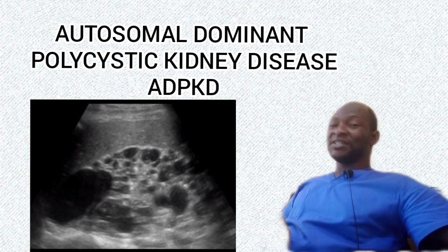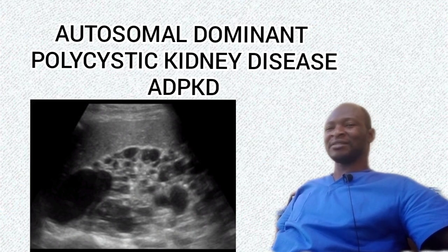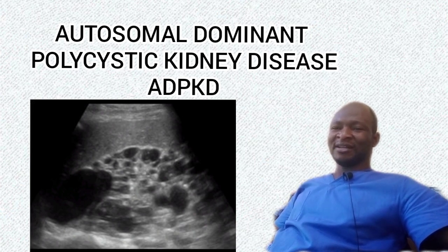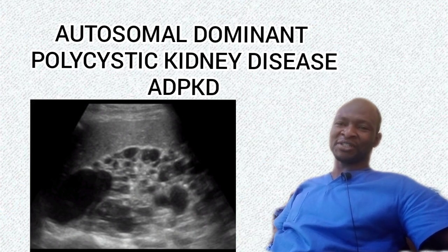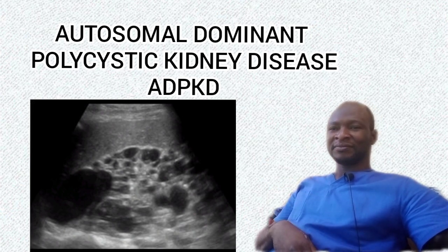In the later stage, the kidneys are huge, sometimes reaching like 20 centimeters in bipolar length, and show numerous ragged-looking cysts of various sizes and shapes, distorting the normal renal architecture, with corticomedullary differentiation lost in this case. The cysts may be complicated with infection or hemorrhage and can contain debris or focal wall calcification. Renal stones are common in this case.